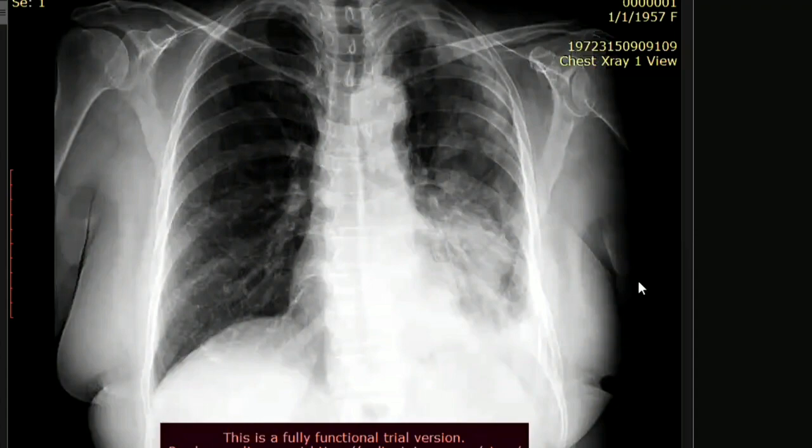And coming towards the bones, they appear grossly unremarkable. So overall, summarizing my findings, this is most likely some mass lesion in the left lower zone with pleural thickening and pleural effusion as well. So, ma'am, do we have a lateral view of this patient?